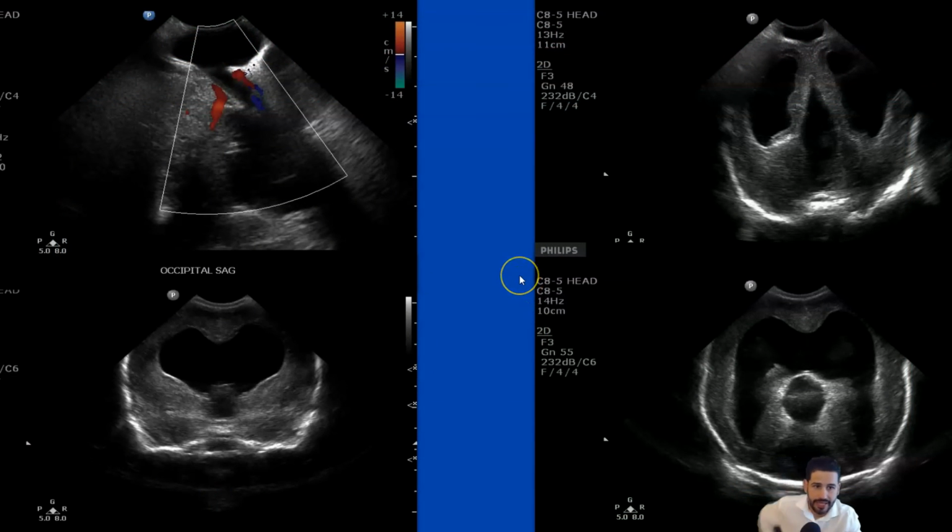And here's another one that on first appearances might give the appearance of absent cavum septum pellucidum, which it is. There is no cavum septum pellucidum, so maybe monoventricle, so maybe holoprosencephaly. But as you can see here, cavum septum pellucidum agenesis. There's also some third ventricular enlargement. And from the posterior occipital view, you can see that there's a cystic structure here that connects right here. So there's vermian hypoplasia or agenesis and a posterior fossa cyst extending outwards, which is a posterior encephalocele. And also, this is a full-term baby, you can see that the brain is very smooth. It lacks gyri and sulci.